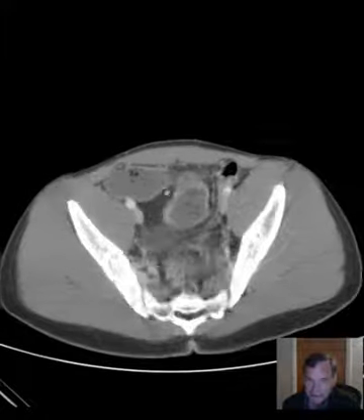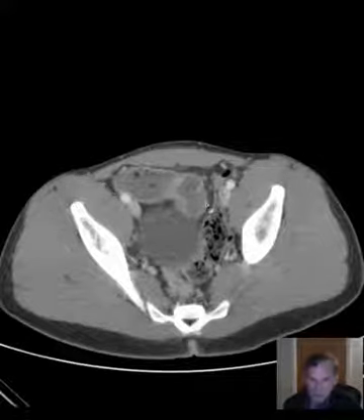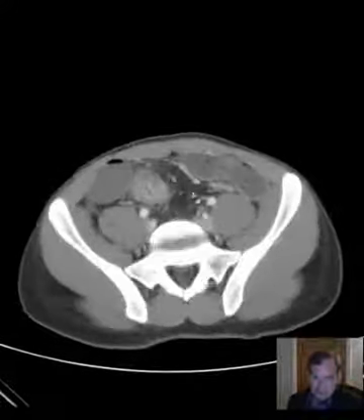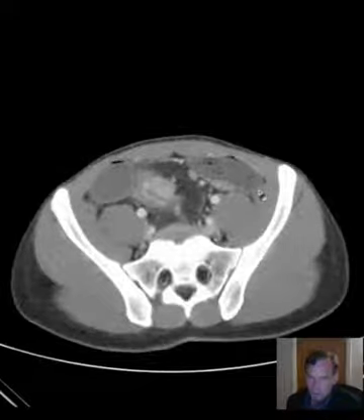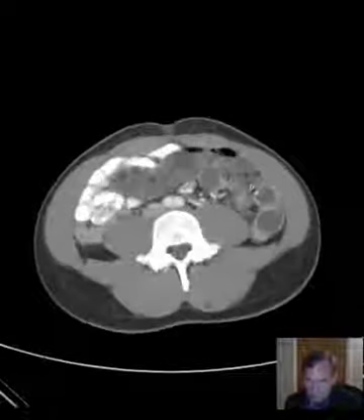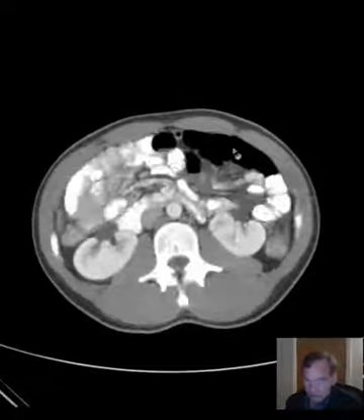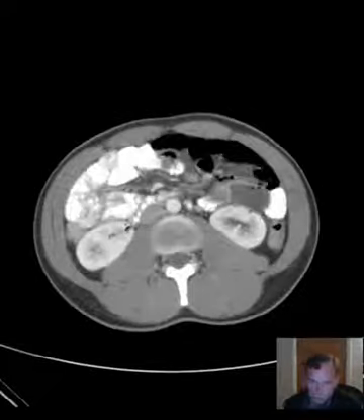When the bowel gets dilated like this, it can kind of twist around and flop, and you can think of water balloons, or the balloons that clowns make shapes out of. When they start getting distended and twisted amongst one another, they can flip from one side of the abdomen to the other. And so I think that something of that nature has happened and caused this small bowel to be distributed more in the left abdomen, whereas ordinarily we'd expect the jejunum, the more proximal small bowel, to be in the left upper abdomen and mid-abdomen, and the ileum to be more in the right lower quadrant.